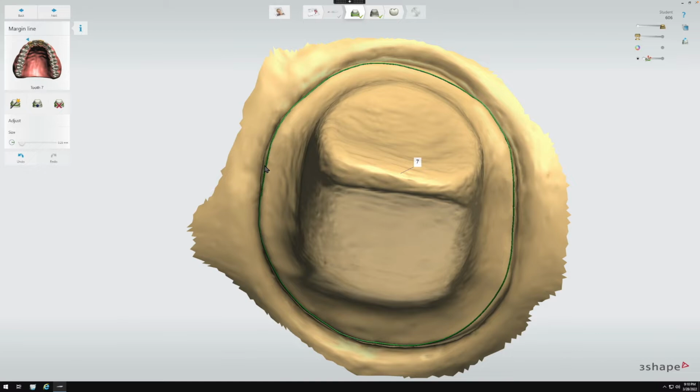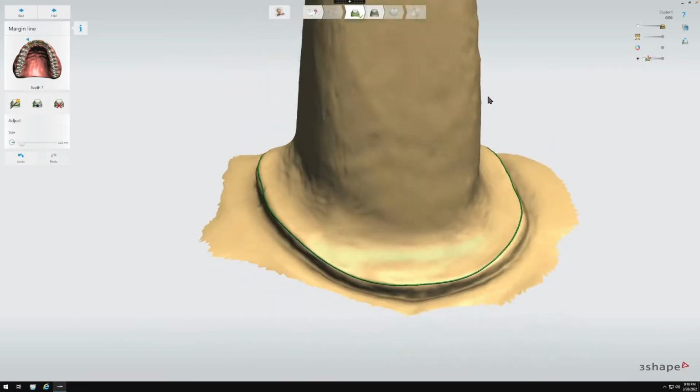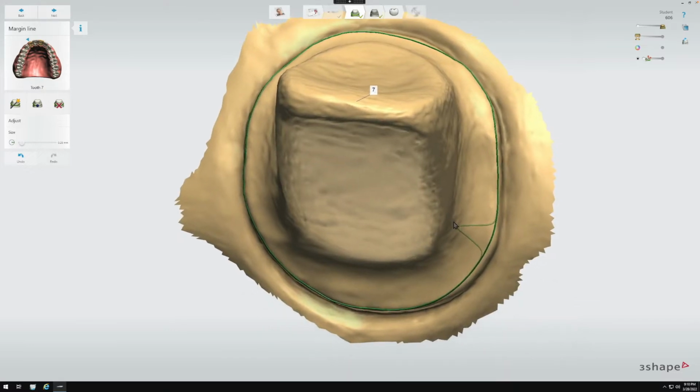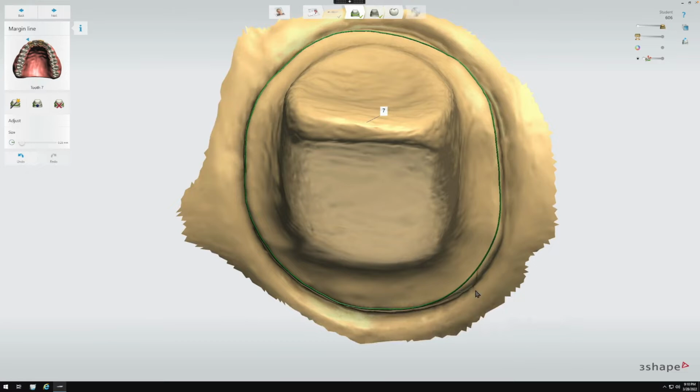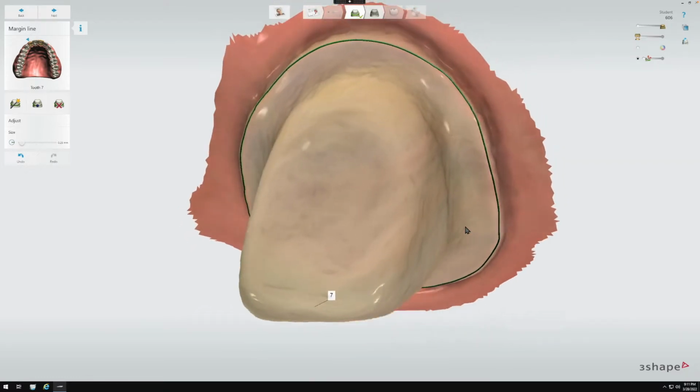That's the proposal. So basically, if I move it over slightly, and let's say that's where I want my finish line to be, when I left click, it'll actually snap it over. So I'll left click, and then it moves it. Let's see if I can do that anywhere else. I like to move this around a bunch to get a better idea of where my finish line is supposed to be. So you can kind of see right here, it probably should be further out. And by moving it over, I'm going to say yes. I think it does belong a little further out.